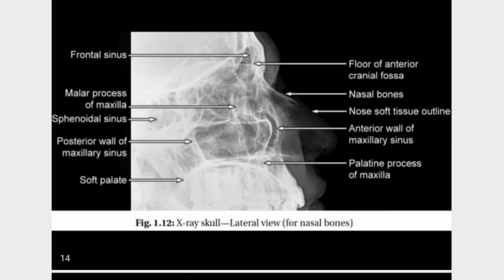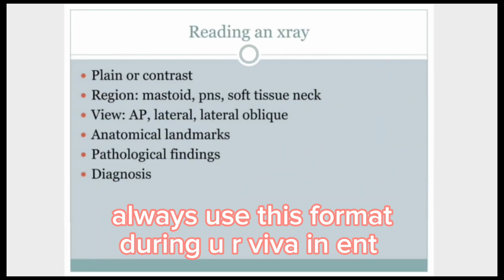This is X-ray of the skull lateral view. Okay, this is most commonly taken for nasal bone fractures. Okay. In the examination hall, the reading of the X-ray is done in this format.